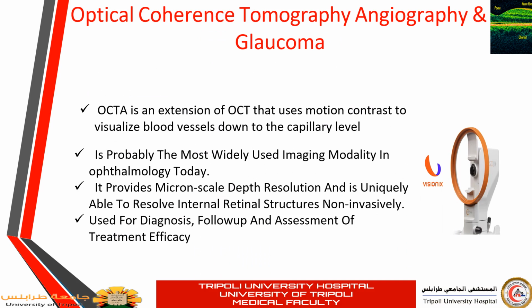Now we will go one step further and deeper in the learning of the use of OCT in glaucoma. We finished speaking about the traditional structural OCTs. Now I would like to speak a few words about the OCT angiography, which is an extension of the traditional OCT that uses the motion contrast to visualize blood vessels.